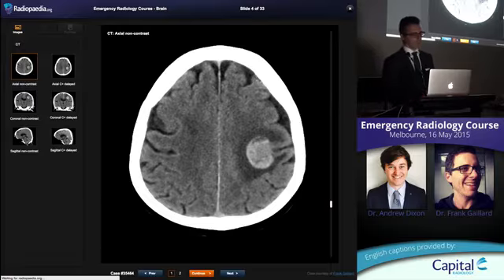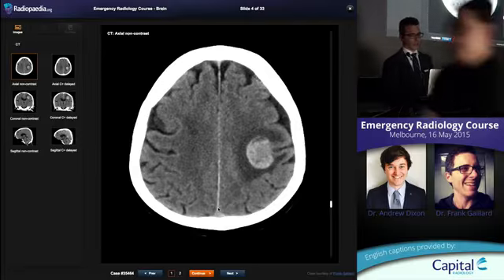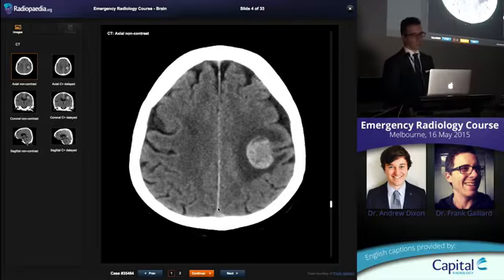And a few approaches. So here we have a middle-aged person with no history of tumour who presents with, say, hemiplegia or a seizure or something, and has a mass. This is the non-contrast CT, and the first thing you'll notice is it kind of looks like that hematoma that we showed before within a GBM, right? Because it's rounded, it's hyperdense. And again, it's too rounded to be a primary hemorrhage. This looks like blood in something. It's located at the grey-white matter junction, which is a great place for metastases generally.